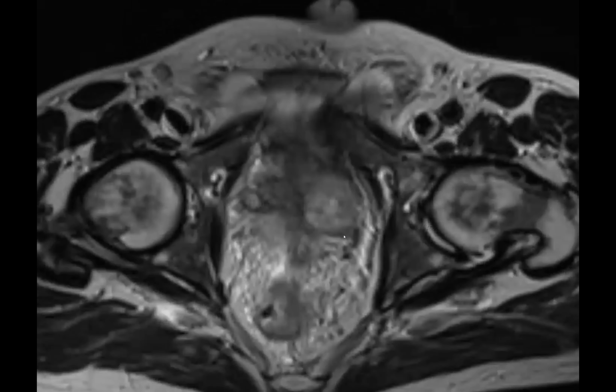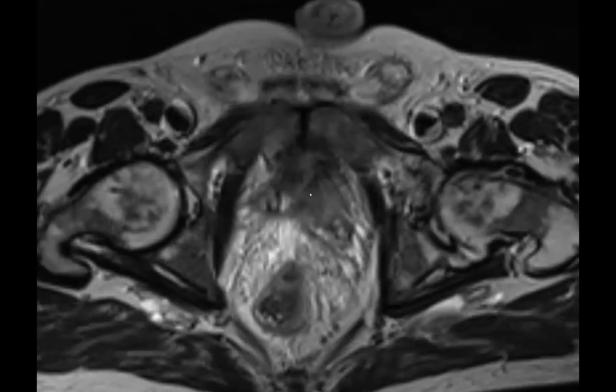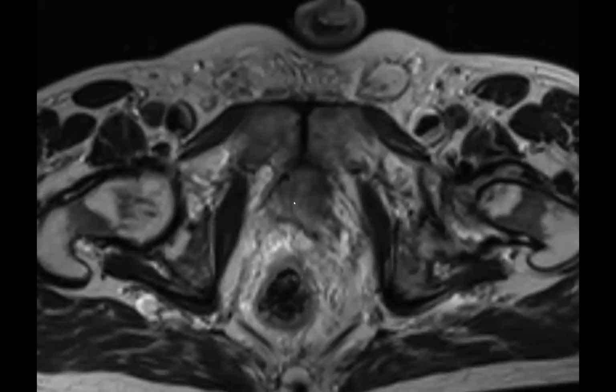I'm sorry, the GIST was arising from where? From the sigmoid colon, the compressed sigmoid colon. Oh, gotcha. It looked like it was coming from the prostate. Well, there's this abnormal signal, but maybe that's just incidental. It was basically involving the edge of the prostate. And by the way, there is such a thing as a prostatic GIST, so they can arise from the prostate very rarely, but it was just invading the edge of the prostate over here. The rest of the prostate was normal.